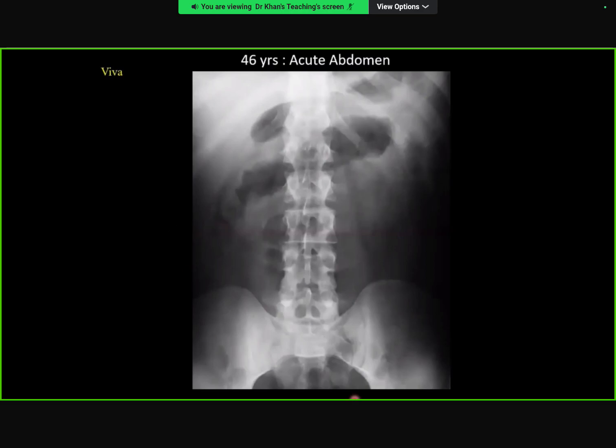There is a tubular gas-filled structure in the midline, which would be in keeping with the transverse colon. The mucosa of this bowel looks a bit inflamed, and I would consider colitis as part of the differentials. I can't see any fluid.